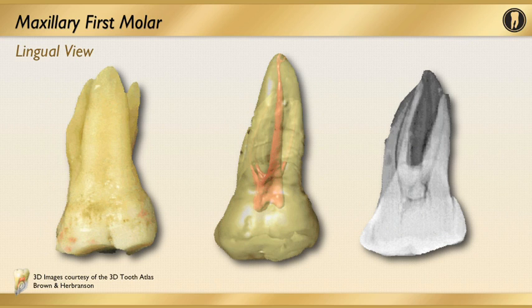In the lingual view, we notice the same complexities and some irregularities anatomically that we've noticed in the other views. From the lingual aspect, notice that the thickness of the roots and the anatomical internal variations are present as well. And again, in the radiographic examination of the 3-dimensional view, we can appreciate the anatomical variations and the considerations that we must take into account before we begin our posterior endodontic access.